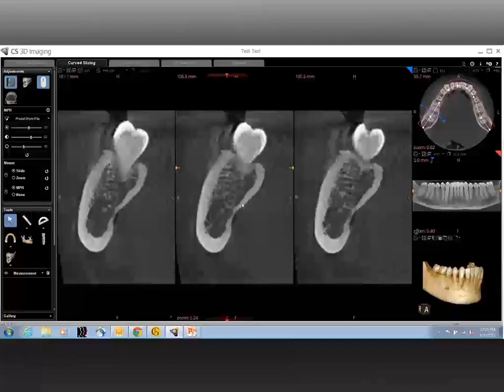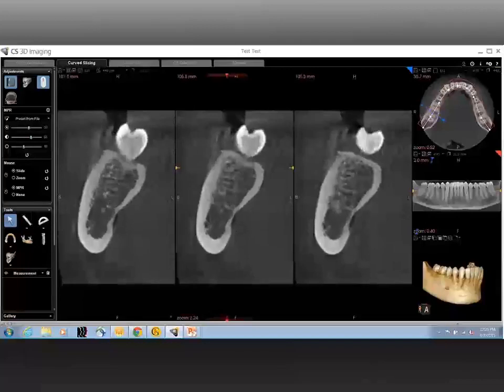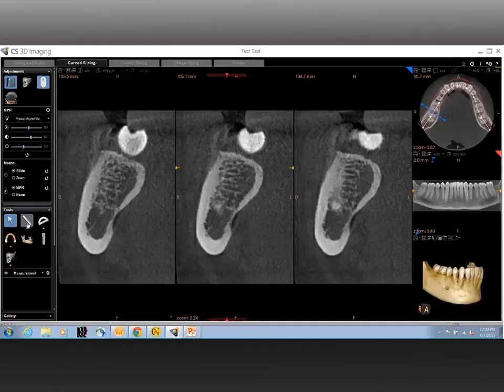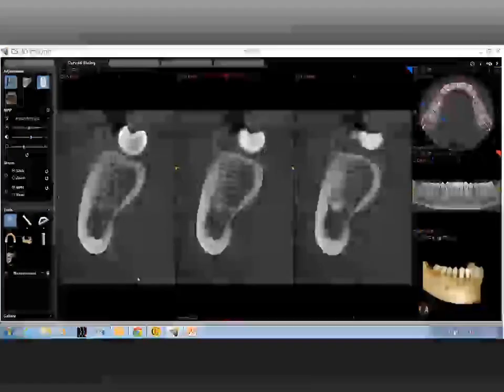And if that was an edentulous area, you have to also make sure that you do not perforate while placing an implant. The length of the implant does not go beyond the lingual undercut so that you perforate into the soft tissue. So those are the three important things: the angulation of the ridge, the lingual undercut, and the morphology of the ridge. Excellent. Thank you very much.